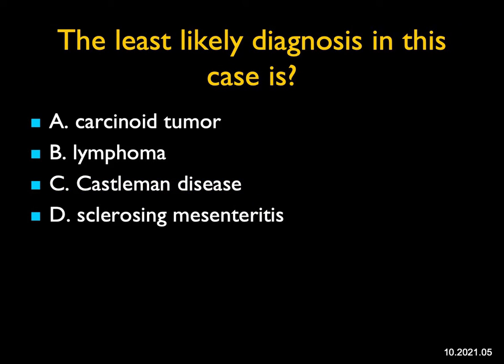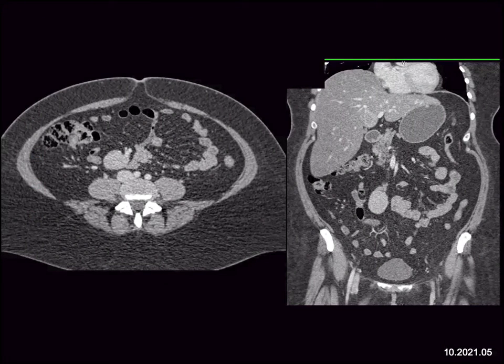This is a great case. There's a mass in the mesentery. It's slightly enhancing. When I look carefully, I really don't see a desmoplastic reaction. In reality, with an enhancing mass in the mesentery, the most common thing I think about is a carcinoid tumor. But usually you see a desmoplastic reaction. Lymphoma is a possibility. Mesenteric masses from lymphoma, one mass alone, is unusual, but it does occur.